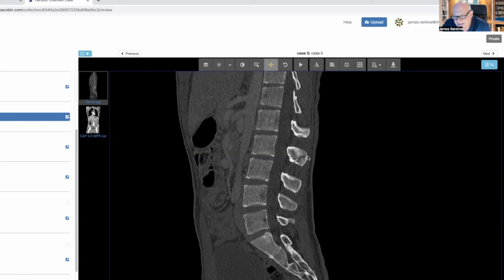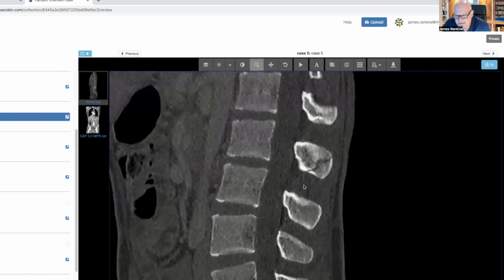And the important point here is that this doesn't just stop here. The cleavage plane doesn't stop there. It carries on through the soft tissues. And again, we've got the dirty fat sign here on CT. Can you see this? We've lost that nice fat.